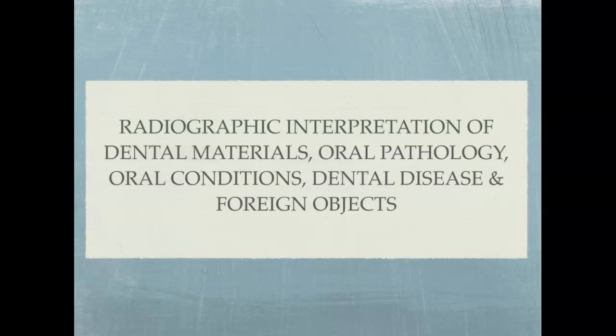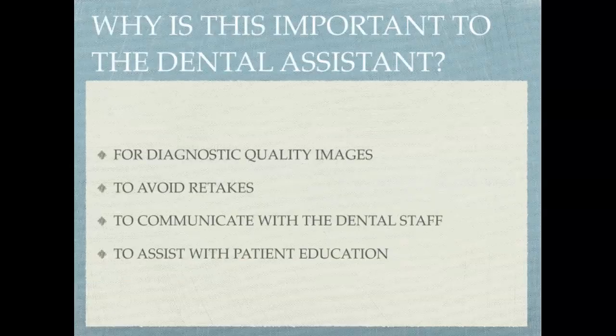Welcome to a slide presentation from Dental Assisting LC, which is geared toward the dental assisting student. This presentation deals with radiographic interpretation of dental materials, oral pathology, oral conditions, dental disease, and foreign objects.